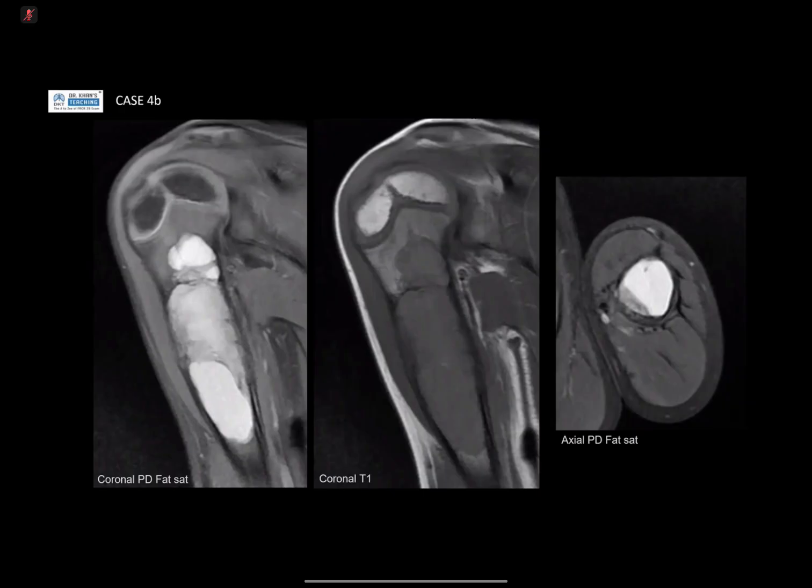Okay. But it's showing me the fluid levels and my differential of bone cyst just on the top. Simple bone cyst. Okay, simple bone cyst. Okay, good. Okay, so I think this is a tricky case. You tackled that really nicely.